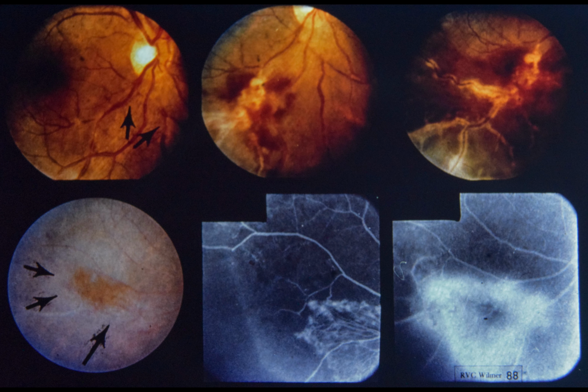Upper center, note retinal hemorrhage and cotton wool spots in same area 3 months later. Upper right, 1 year later, note marked periphlebitis and extensive retinal hemorrhage. Lower left, large arrow points to peripheral neovascularization in nasal periphery of left eye. Small arrows indicate obliterated retinal arteriole distal to neovascularization.